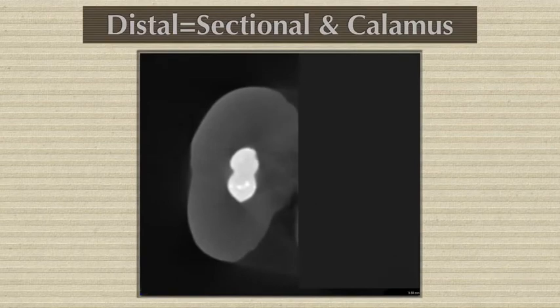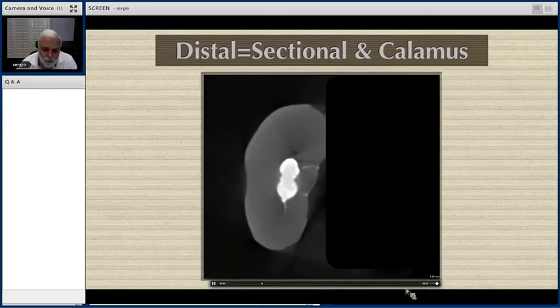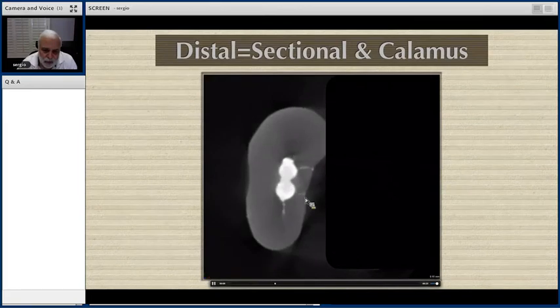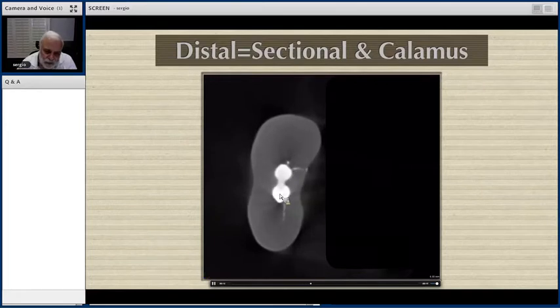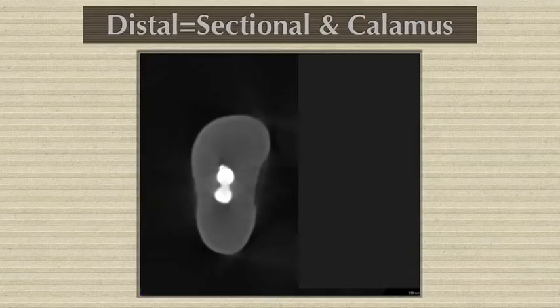So let's look at the distal canals. You can see here now, very soon you're going to be seeing voids. I was able to flow cement into the accessory canals, and look here, some voids. Okay, you can see the cement. Look at these voids, more cement and more voids.